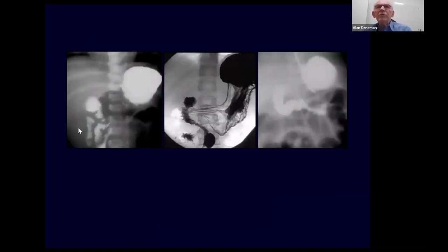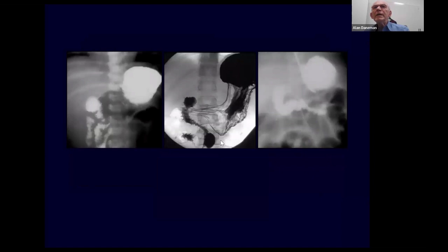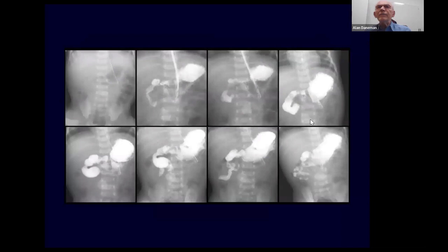In malrotation, the proximal duodenum and jejunum can be on the right, or they can come down the midline, which I find is the most common, or they can actually cross to the left but be low. So there's absence of that fourth part of the duodenum going up. And this shows why on the upper GI series, there is such a variety of positions of the duodenum in malrotation. I'm going back to the normal. This is the normal, always going over to the left. Proximal jejunum is in the left upper quadrant, but in malrotation, the duodenum and proximal jejunum can either be on the right, down the midline, or low on the left.